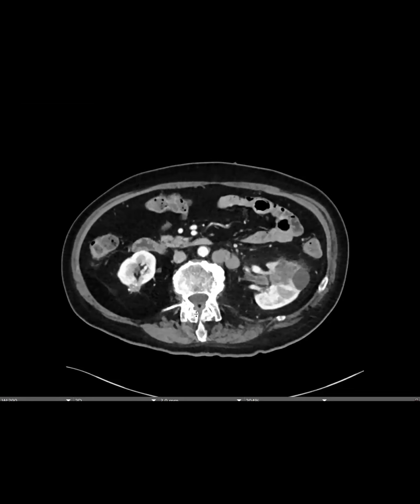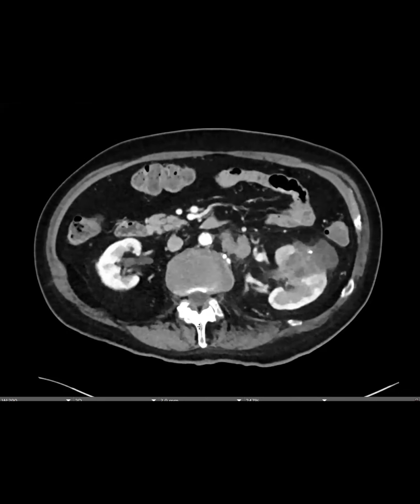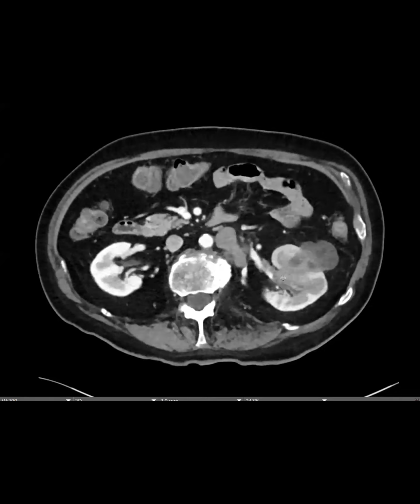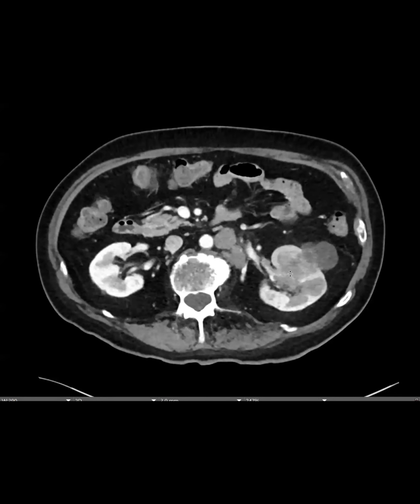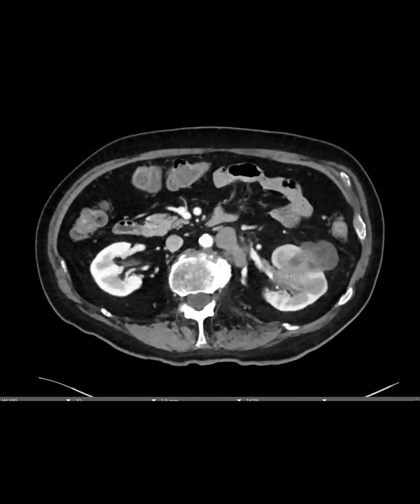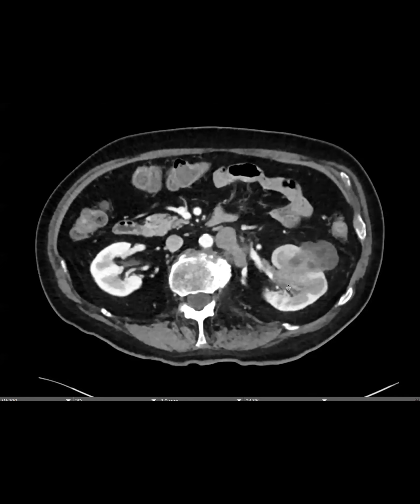Okay, now what was this? So this was RCC. This was clear cell RCC. It has a TCC appearance, as already alluded to. It has a very reniform shape. Even the enhancement is kind of homogeneous, a little bit more homogeneous than typical clear cell RCC, and it doesn't hyperenhance and wash out like classic clear cell. But this was biopsy-proven clear cell RCC.